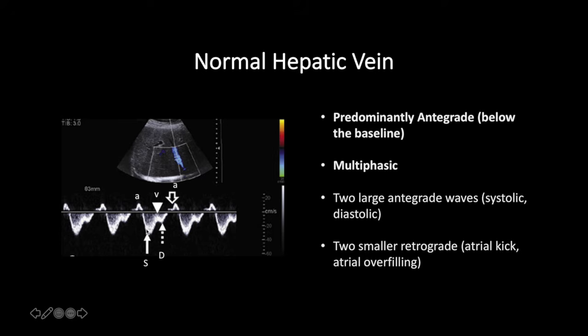As a result, a lot of blood is moving into the right atrium, filling the right atrium. And so that's what the S is. It's filling of the atrium during systole. So much blood rushes in that eventually, against a closed valve, the atrium is going to start to become overfilled. So the filling is going to start to slow. And then the V refers to the valve opening. When the valve opens, the ventricle and atrium are now in contiguity, and blood can go into the ventricle. When the blood goes into the ventricle, the atrium can now fill more.